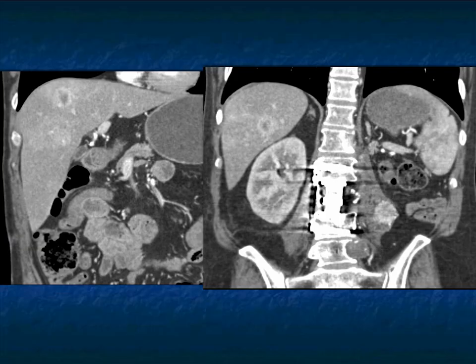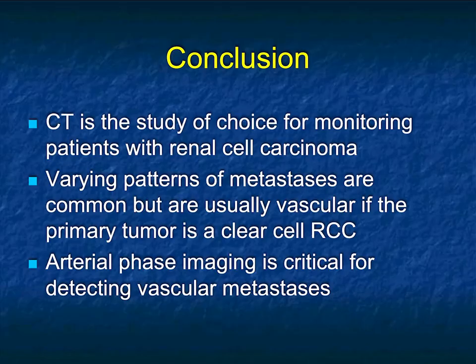Same patient, a little more images, the met to the psoas muscle on the left side, the met to bone, nodal disease by the duodenum, as well as multiple liver metastasis. That constant quagmire of not just one lesion, but multiple lesions in multiple organs.